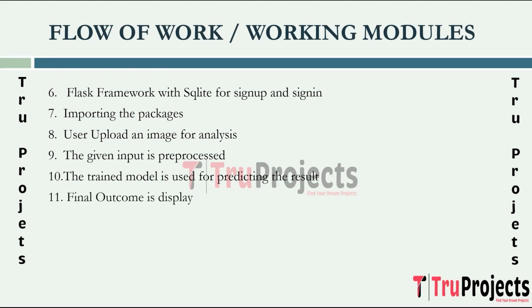The last step is the final outcome is displayed. The result of the prediction is displayed to the user. This includes information on the severity level of the diabetic retinopathy in the uploaded image. The user interface communicates the model's findings in a clear and user-friendly manner.